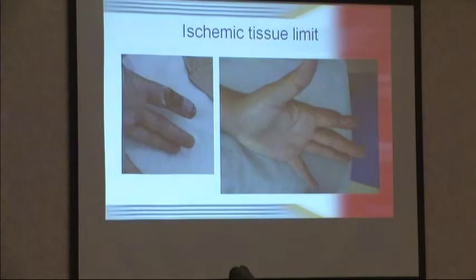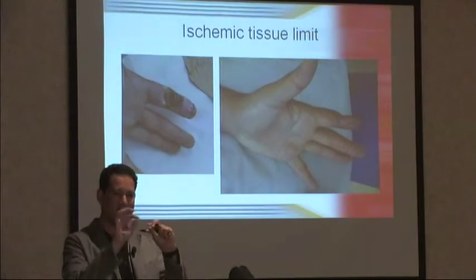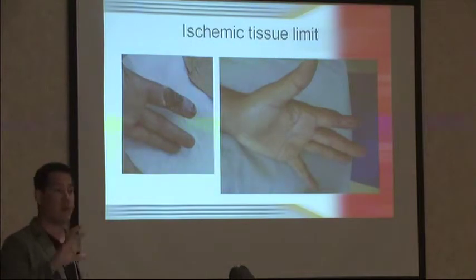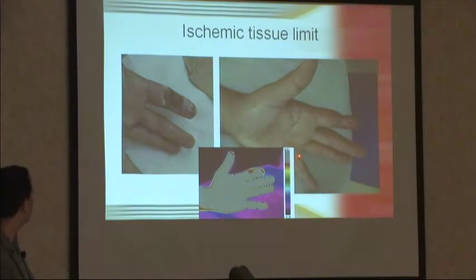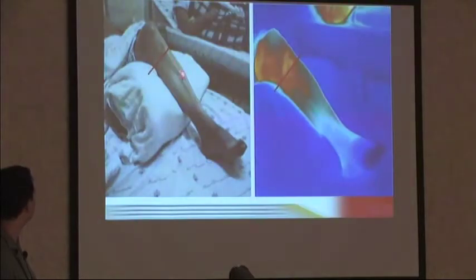It was not possible to study this by ultrasound because they are very thin vessels, very difficult. And this application for thermography is very, very good, very specific. There's nothing very new here, just measuring the temperature. And here is the isotherm, showing the 0.3 area, and we said we will help this man. Okay, it's another case of limb amputation.